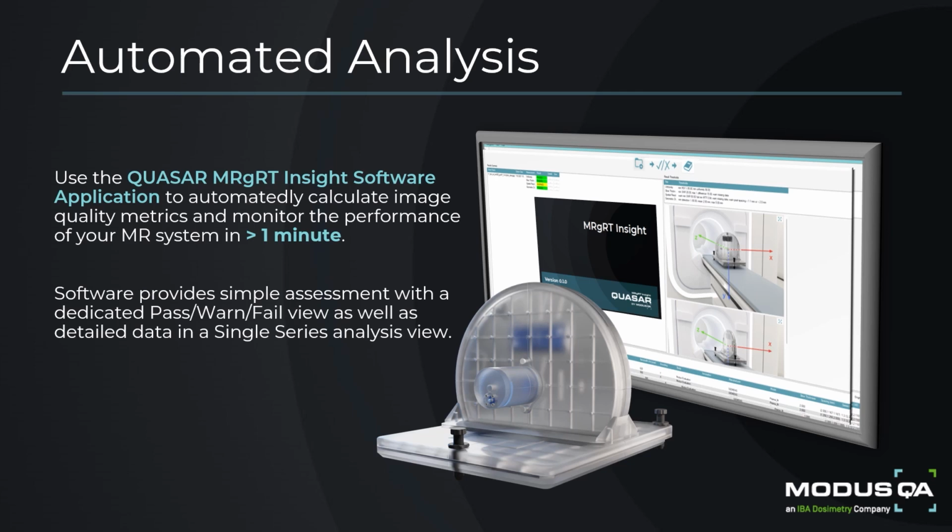And if the metric is indeed out of tolerance, it will then ping in red to notify you, otherwise it will just remain in green. So this is actually going to be a quick and easy summary of the information, which can be used to help expedite daily morning QA.